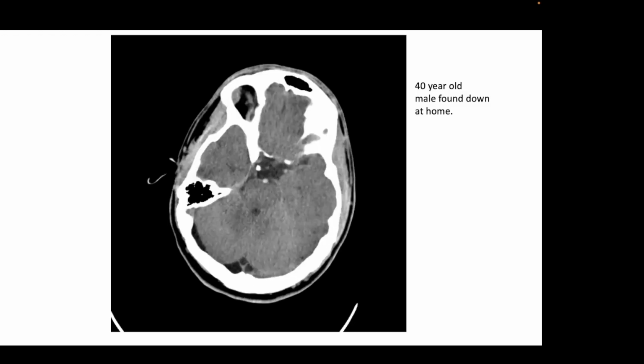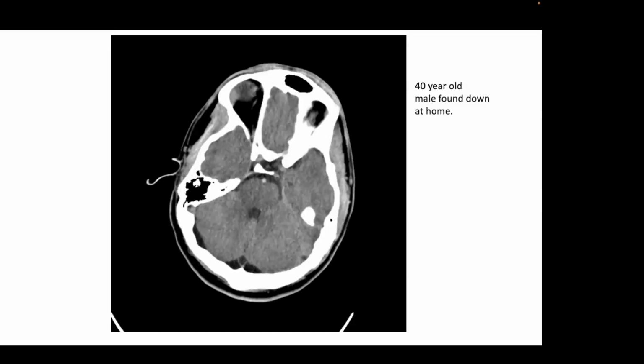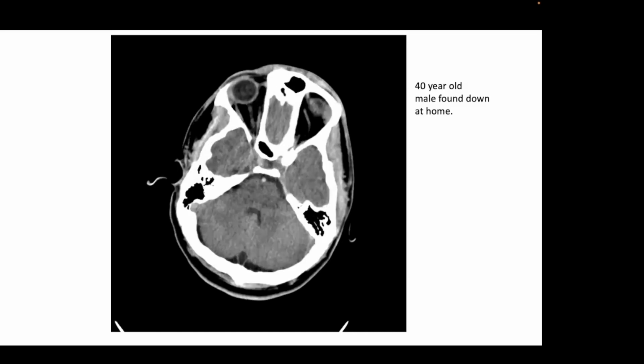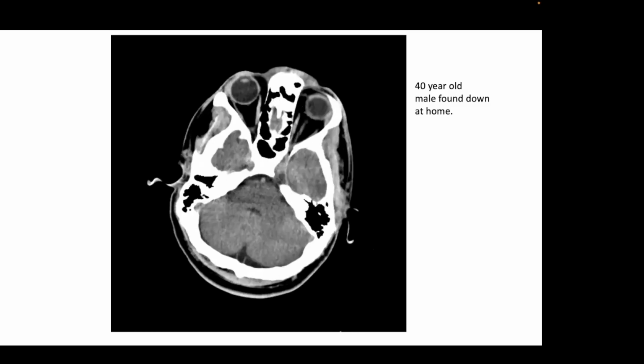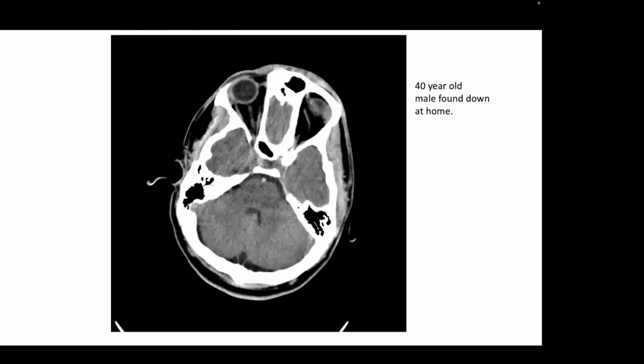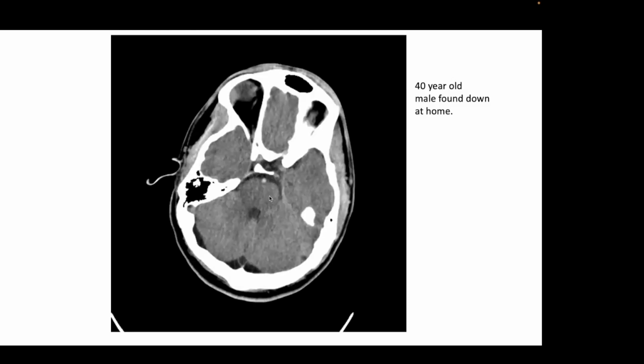Mariana, do you want to tell me what you see on this scan? I see a thrombus in the basilar artery. Excellent, exactly. Now this, in my opinion, is a difficult diagnosis, and I think you nailed it.